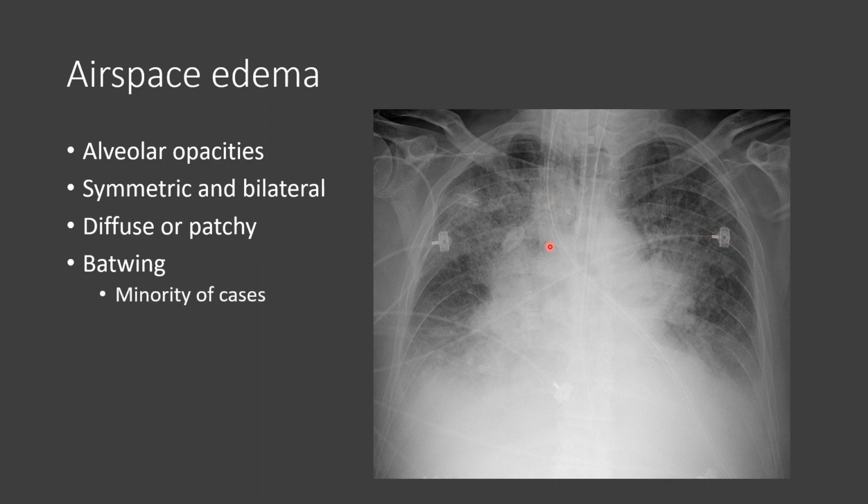However, a true batwing appearance, where we don't see the vascular congestion, where we don't see the septal lines, is fairly uncommon. It represents only about 10 to 15% of cases.